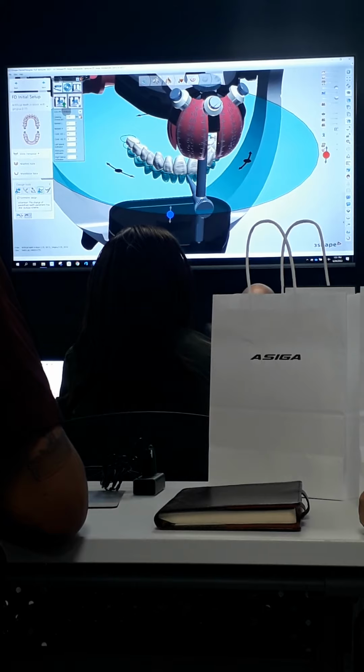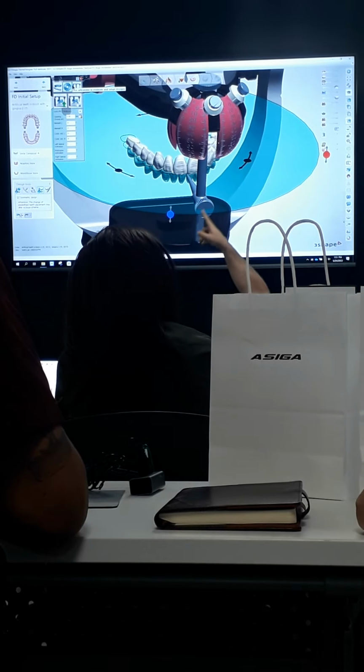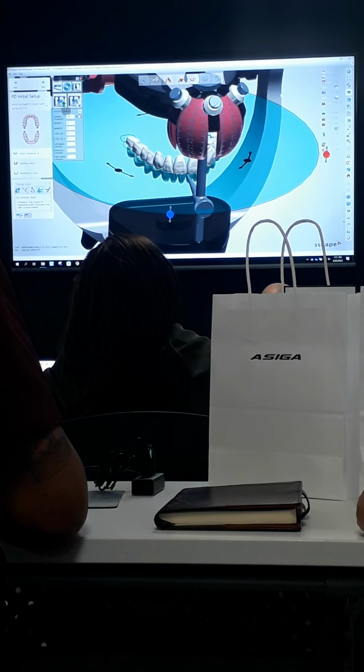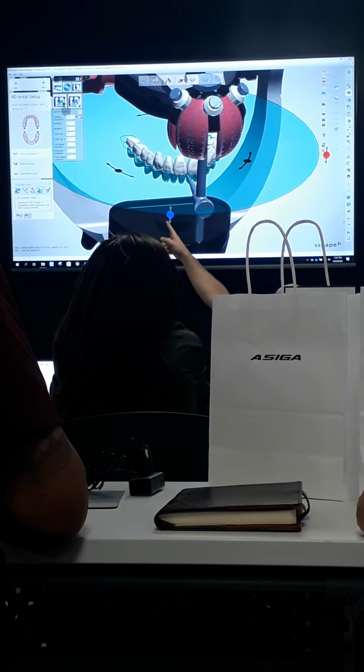Then I'll go up here. So up across the top of the virtual articulator box, there's three icons. You're going to want to use the rightmost one to go into the functional step. Now, let's say this case you knew you were going to need to open the vertical for the immediate, maybe the patient was over closed. You're going to want to use that opening and incisal pin section there to do that.